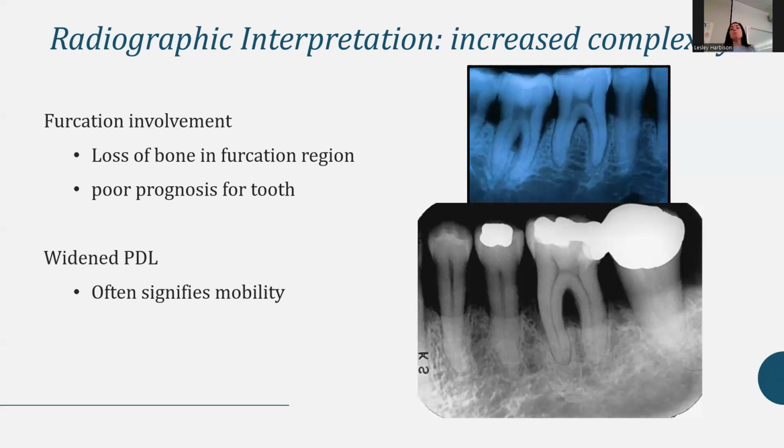It is furcation, but it's really both, but it's furcation. At this stage, that's furcation involvement. You can verify that clinically with your probe. If you can go in and feel that dip, then you'll verify it that way. But I would say that it's probably more than just a widened PDL. It's some bone loss there.